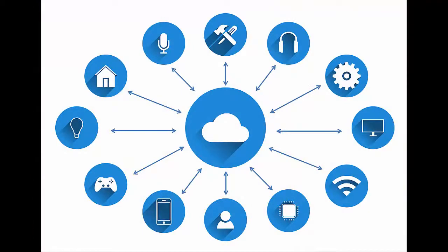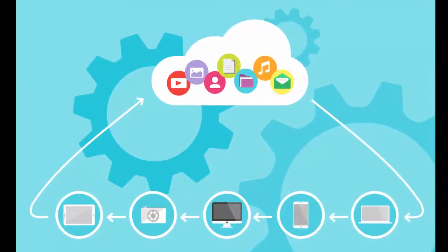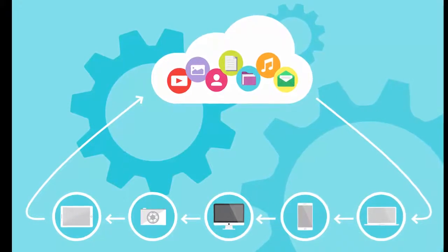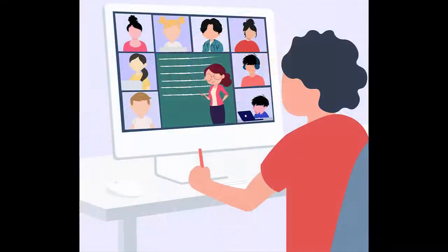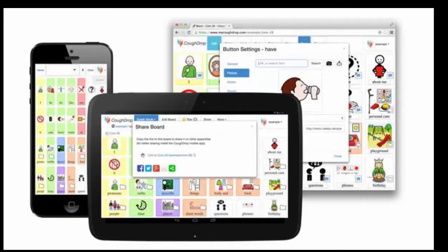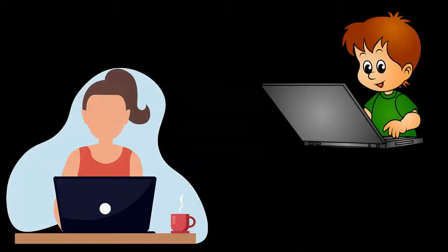One of the really great things about CoughDrop is that it's cloud-based. You know all about the wonders of the cloud. Speech boards and settings of your account are saved securely in the cloud, and the account can then be opened on just about any device and will display the same boards and options that you saved somewhere else. This function is especially helpful while doing AAC remote therapy or learning. Adjustments that have been made to a student account from your laptop or iPad will show up on the student's device at home or elsewhere when the account is synced and reloaded on that device. This has been especially helpful this year as AAC users and their supporters aren't always able to meet face-to-face.